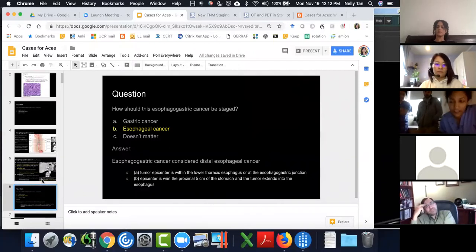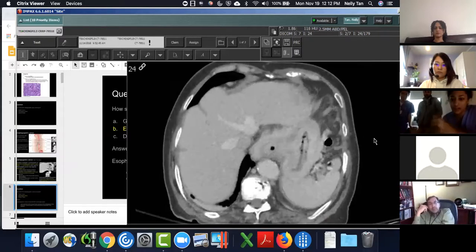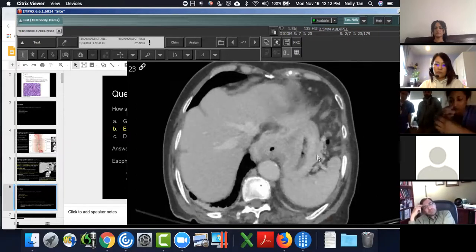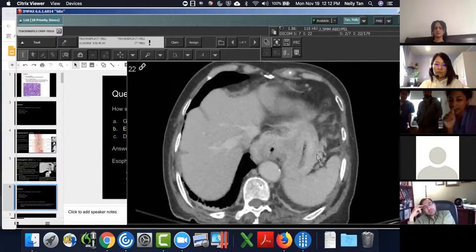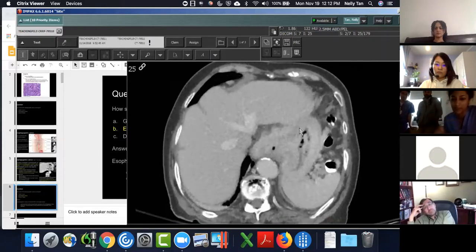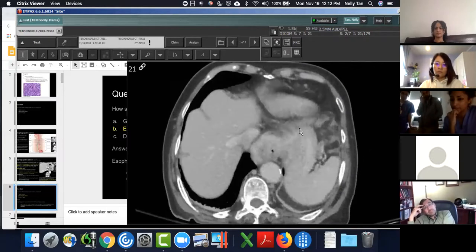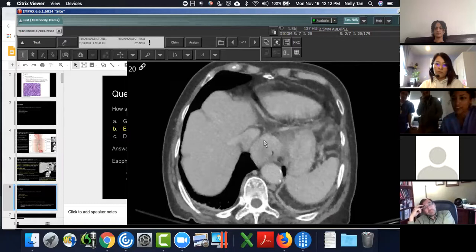I actually think that's a really good point, and I sometimes use that for my residents. In your case, where you see that dense enhancement, that is all thickening of the mucosa, so you know that it is a mucosal process and a tumor process. Whereas if you see a very thin mucosa and then mostly submucosal edema, dark edema below it, then that's usually gastritis, because it won't be as enhancing. It's just edema. So this part is enhancing. That's why we're considering it.